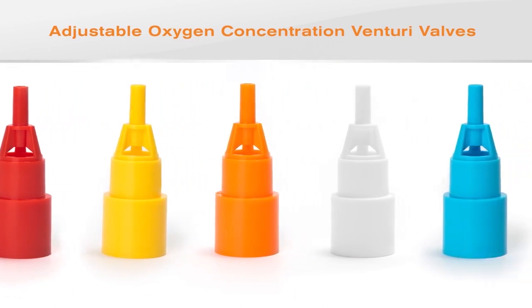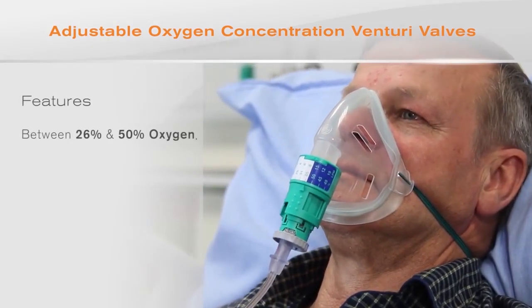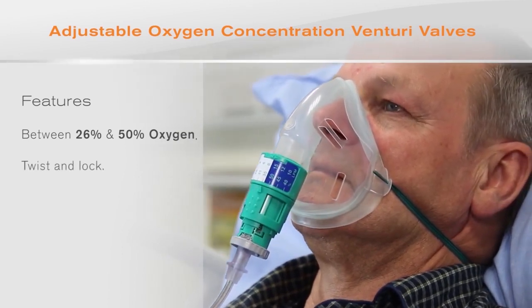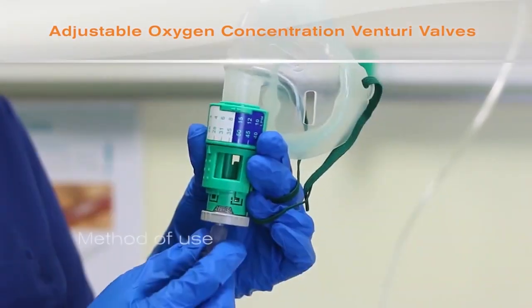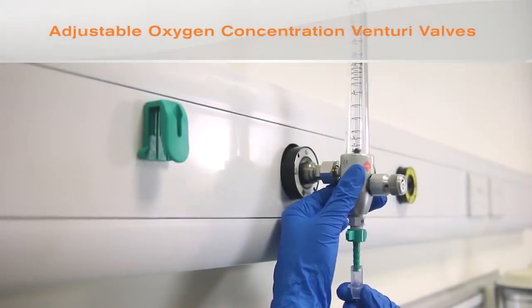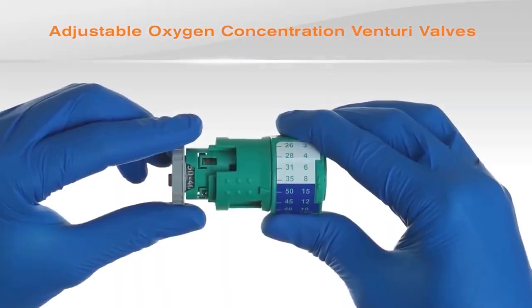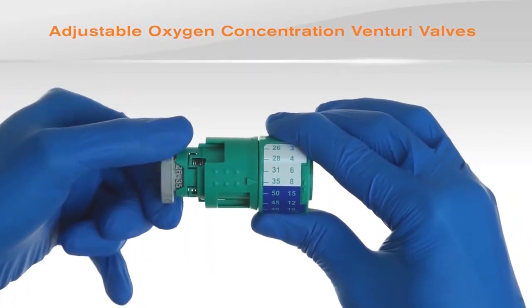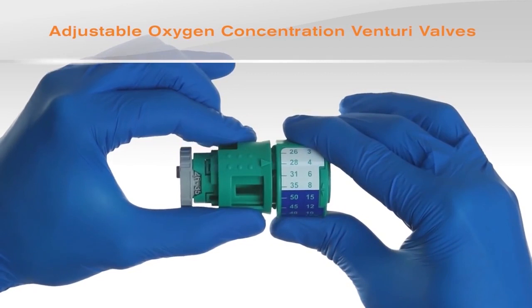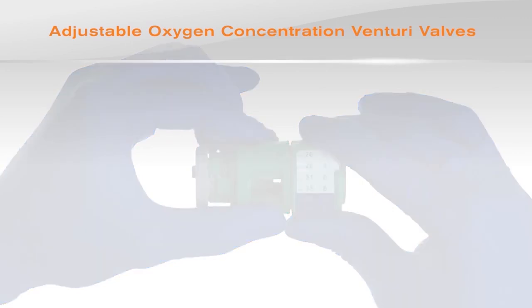The Silente adjustable Venturi can be set to concentrations between 26 and 50% and incorporates a twist lock mechanism to prevent inadvertent concentration changes. As with a fixed valve, attach one end of the oxygen tubing to the valve spigot and the other end to the oxygen flow meter. To select the desired oxygen concentration, ensure the range selector sleeve is in the appropriate position. If the desired concentration is between 26 and 35%, then ensure the oxygen range selector is set to 26 to 35.